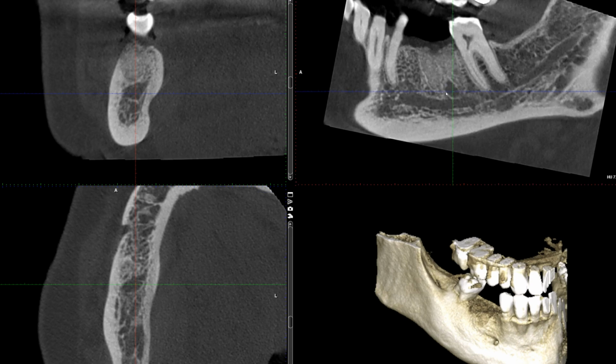It doesn't have that spherical, balloon-like radiolucency, but it's well-defined and somewhat irregular. It doesn't have that balloon-like appearance. And that is even more true when you look at this in the coronal section. It has a somewhat amorphous shape to it, and that's also true in this axial section.